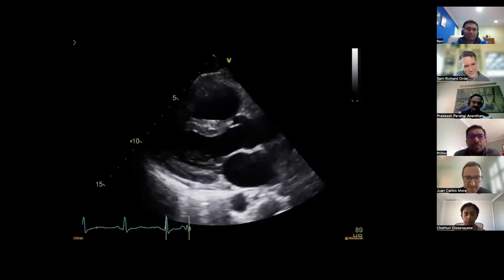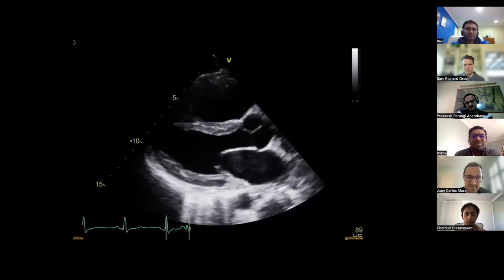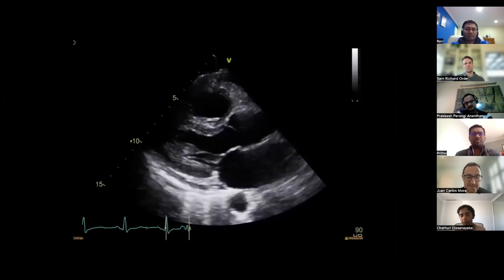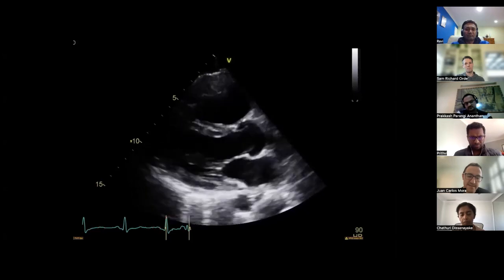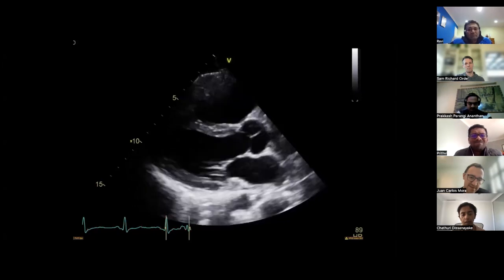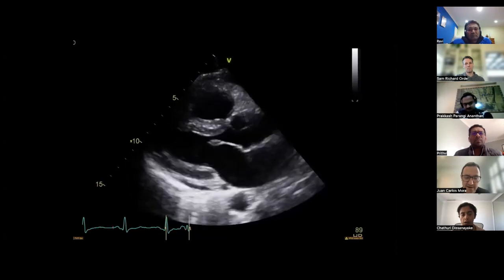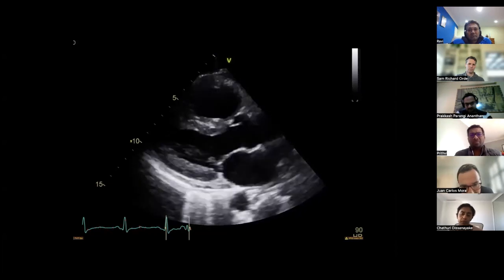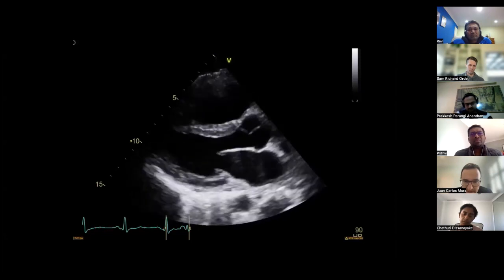So yeah, we've got a parasternal long axis view. Nothing's jumping out at me. I mean, the RV potentially looks dilated, but obviously I can't assess accurately from this image. I'll have to look at orthogonal views. The LV size, wall thickness, and global contractility appear normal. And again, with regards to the murmur, the question in hand, both the aortic valve and the mitral valve appear to be opening well. The leaflets appear thin and pliable. The atria look normal size.